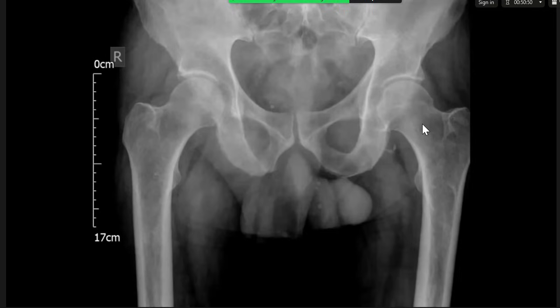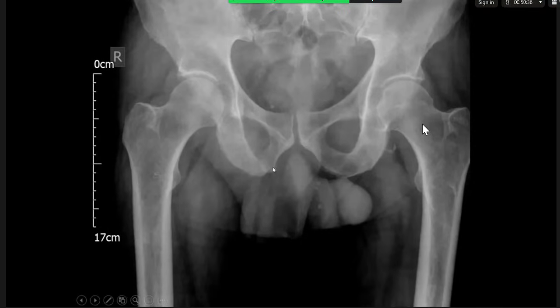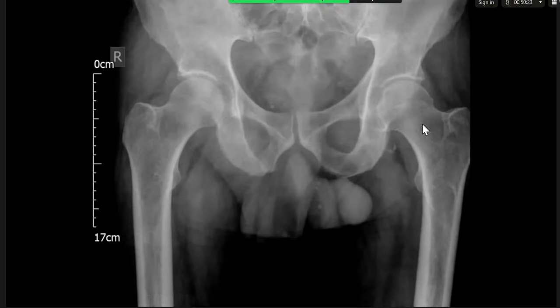So actually what I was perceiving as lucency on the left could be sclerosis on the right. I'm seeing thickening of the iliopectineal line. Can you please point out if your mouse function is working? So yeah, excellent. So you've picked up something, and with that, where is the soft tissue asymmetry? Okay, very good. What will you do next? I would need to evaluate, preferably with MR, if resources would allow. So over to you, please.